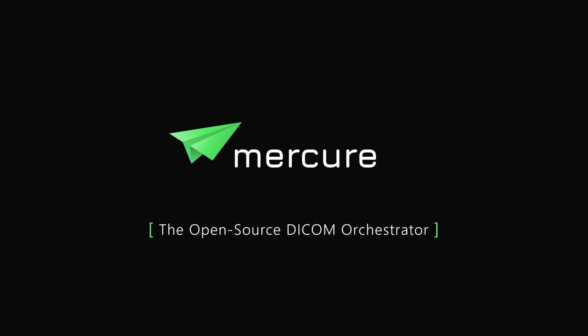We are very excited to show you our new open source platform called Mercure, which makes it really easy to deploy machine learning algorithms into clinical practice. And in this video, I'll explain what you can do with the software, and I'll also show you a short demonstration.